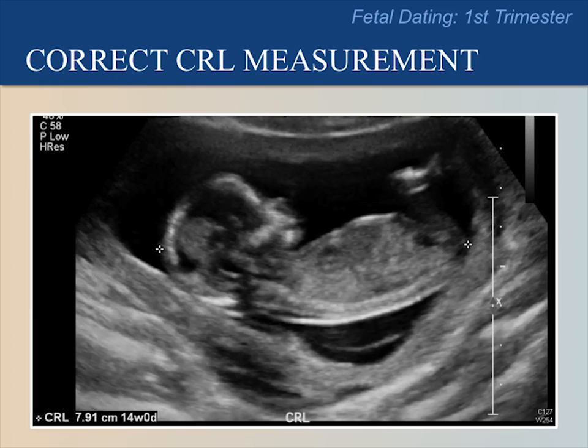Please discuss the following questions in the group. Is this fetus in a neutral, extended, or flexed position? Is the fetus in profile? Are the calipers correctly positioned? Please pause the video now to discuss the answers.